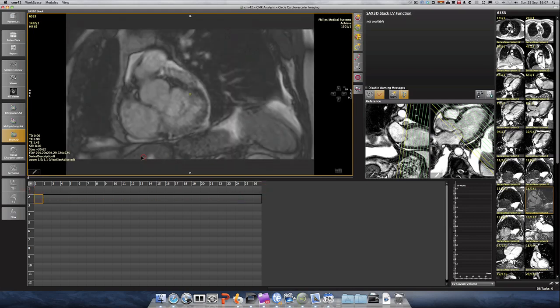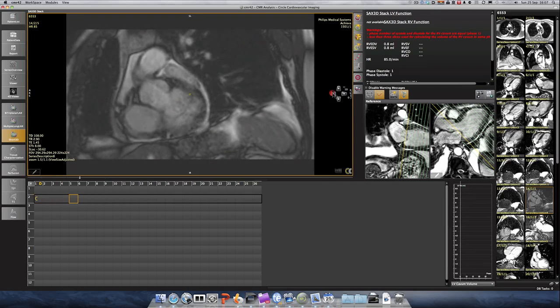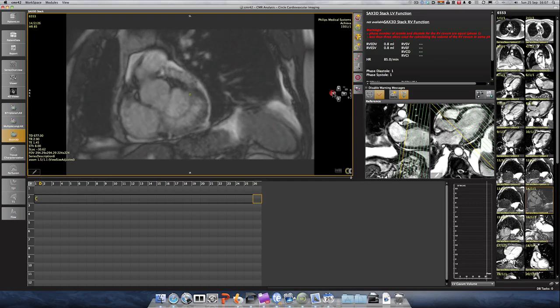You go one further down, would you include this? This very much looks like the right atrium, very much looks like the aortic valve, very much looks like the pulmonary valve here, so this is above the pulmonary valve. You could argue if this is the pulmonary valve, then this is part of the right ventricular outflow tract. So in theory you could argue let's draw a contour here, and that's as much as I include, because this is the right atrium. If you're unsure about right atrium, go into systole and you can see that this is changing its shape and it looks like it's the right atrium.